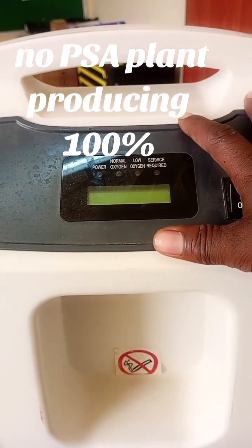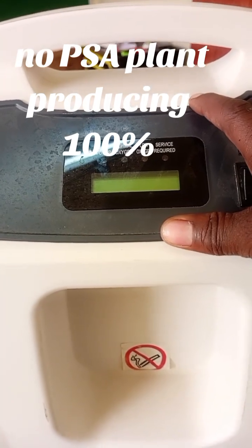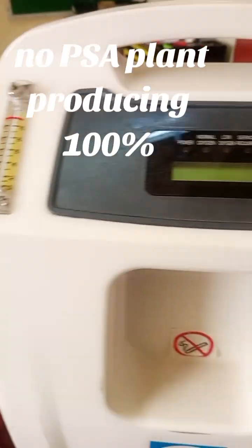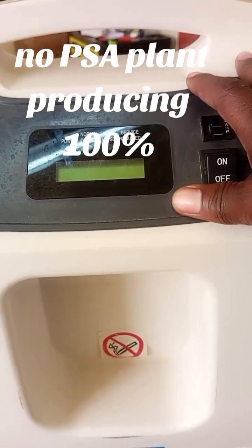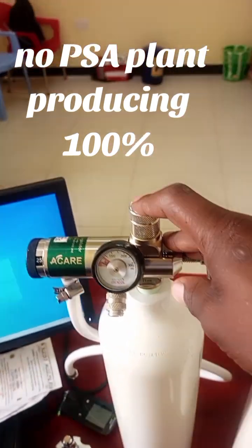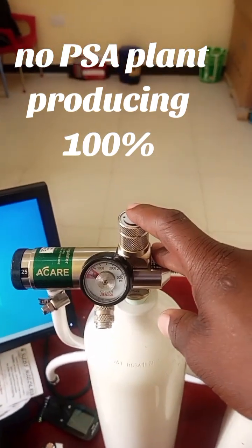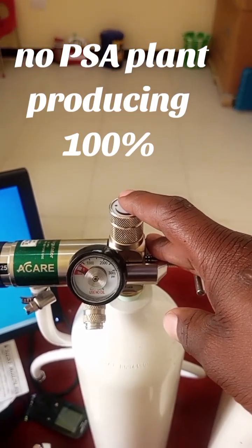But this one mostly produces 90% to 95% purity of the gas. So you may see the difference between these two devices: this produces a constant gas supply, but the purity is low, 90 to 95. Although this one cannot produce a constant gas supply, because in some circumstances the gas may cut off and needs frequent replacement by the user to ensure a constant gas supply to the patient.